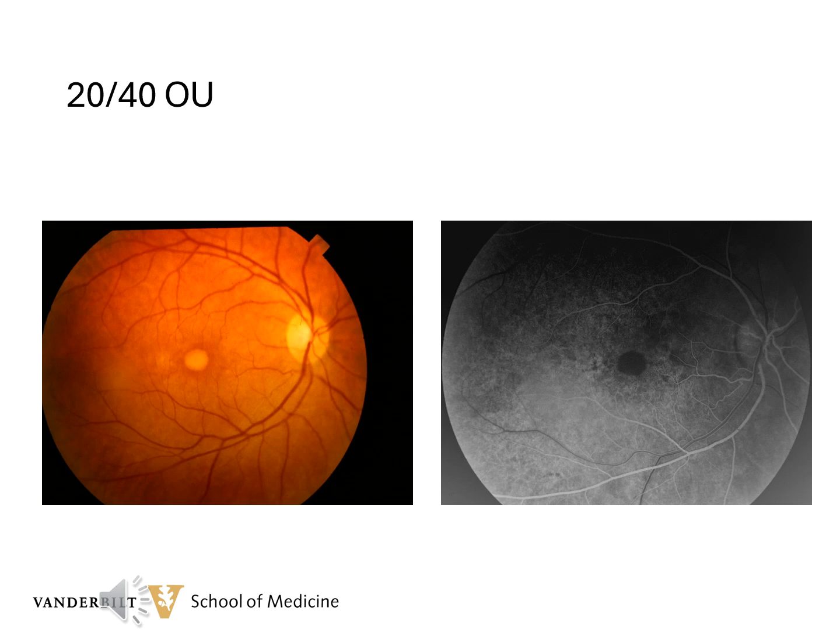This is a patient who has Best's disease with a vitelliform lesion centrally. You can see this as the yellow spot in the fovea in the color photograph. The fluorescein angiogram shows blockage of dye centrally by this yellowish material. Of interest, the EOG was 1.43 in the right eye and 1.74 in the left eye.